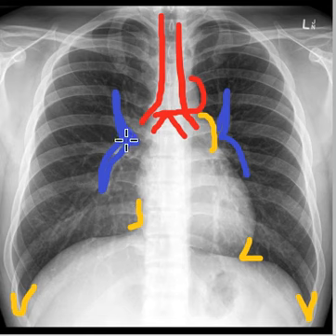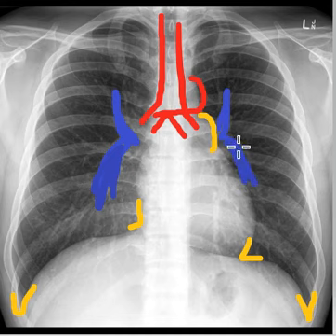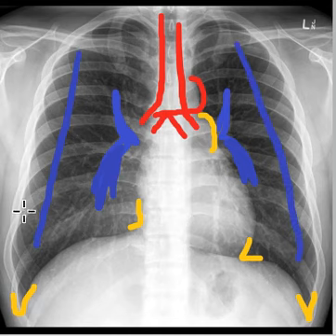The hilum normally originates somewhere beneath the fifth rib. So if this is the second rib, third rib, fourth rib, fifth rib, then we have the hilum originating somewhere over here. Normally these vascular markings are greater in the lower portion of the lung, and they are much less in the upper portion, and that's because of gravity. On the other hand, if we look at the periphery of the lung, this area over here is devoid of these vascular markings.